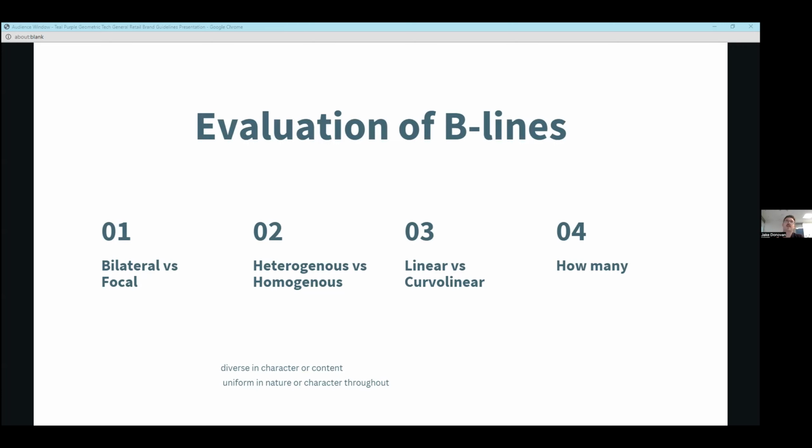And I think if you're looking at pleural effusions or at the base of the lung, you really want a curvilinear probe as well. There was an interesting study done recently where they compared curvilinear versus phased array for detection of B lines and said that curvilinear was better. And there's a couple of things as well in the 2023 consensus document that say that the frequency and the type of probe you use is actually really important to how many B lines you see. It does make a difference which probe you're using and what the frequency is. And they've determined that the curvilinear is better for identification of B lines. So there you have it.